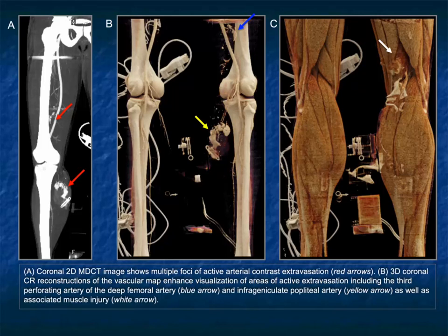So again, this case also reinforces something we all know in radiology in general, the importance of looking beyond one finding. You found one site of bleeding, you say, okay, the patient's bleeding, next case, but you got to keep looking because there are multiple sites of bleeding.